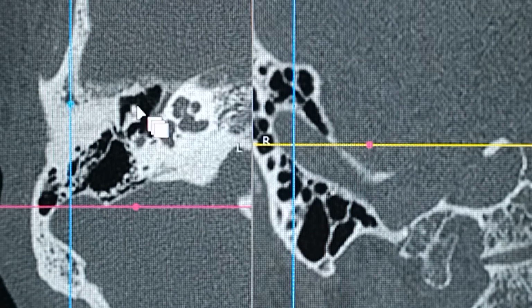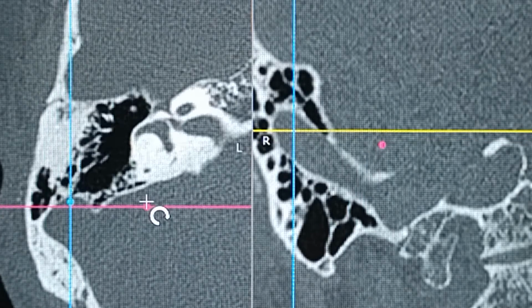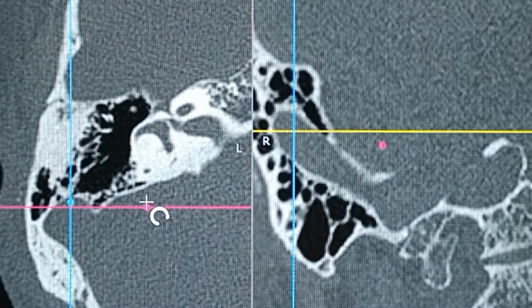The ice cream being formed by the malleus head, the cone being formed by the body and the short process of the incus. That's the aditus that connects the attic with the antrum basically. That's the sigmoid sinus right there, and this is from where you enter and you prevent entering the sigmoid sinus accidentally. That's it about the basic ossicle structure.